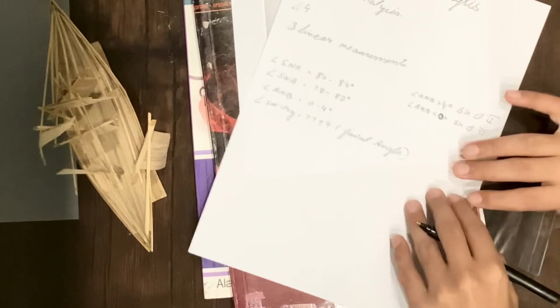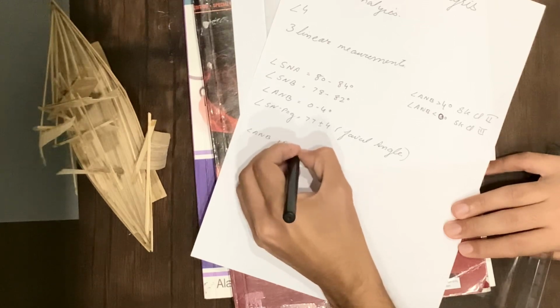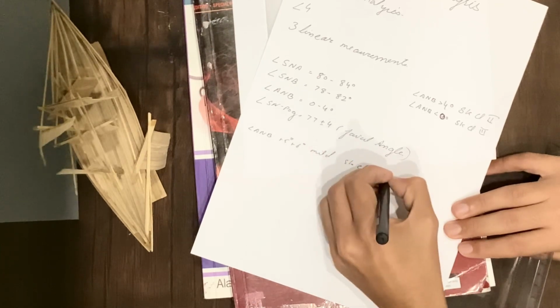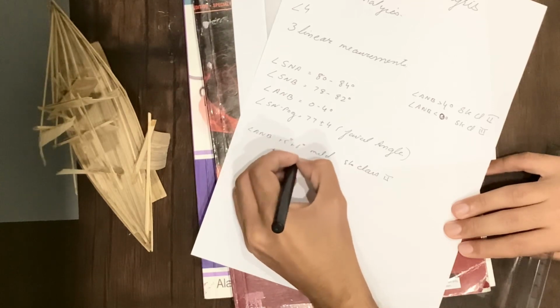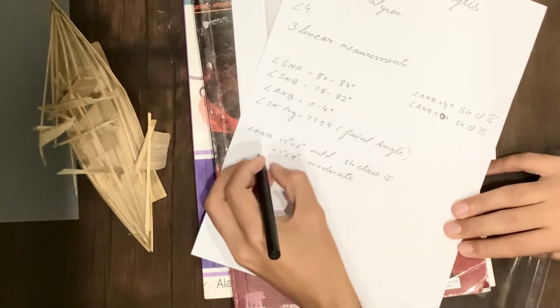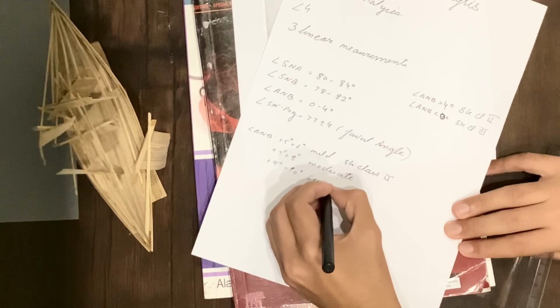According to the severity, if the ANB angle is between +5 to +6 degrees, then it is a mild form of skeletal class 2. If it is between +7 to +8 degrees, then it is a moderate form of skeletal class 2. And if it is between +9 to +10 degrees, then it is severe skeletal class 2.